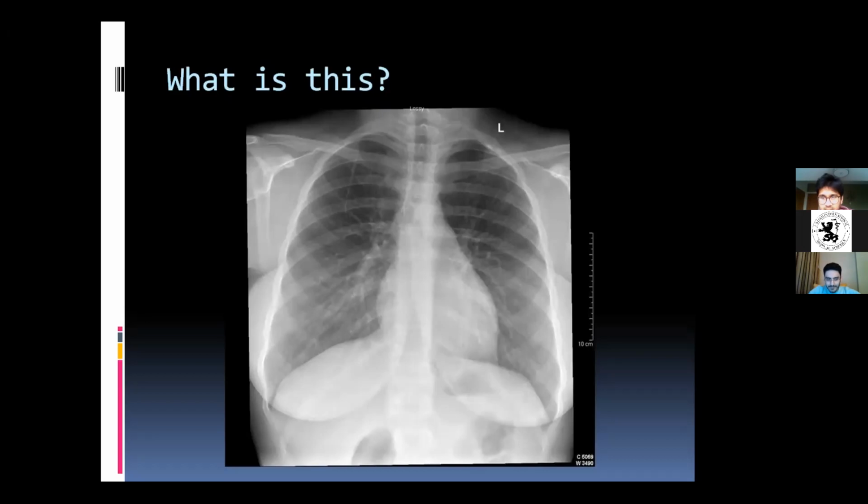Let me try. No idea. Okay. What's that? Cancer. So we've just stepped it all the way up to cancer. I've highlighted over a few. What is that? It's that weird bit of thing over there. Does anyone know? Ooh, fracture of the first rib.